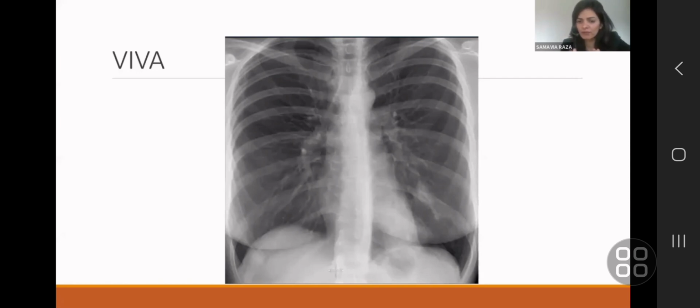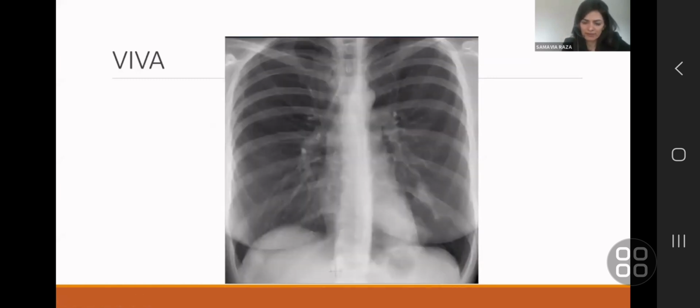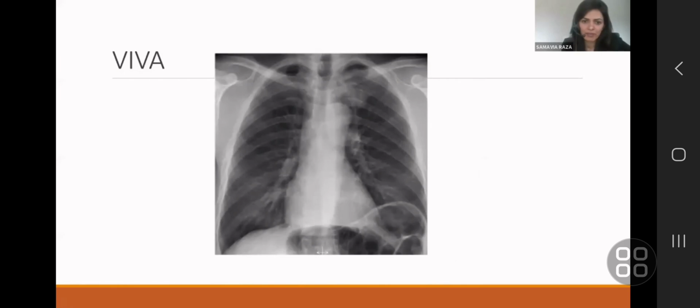There is no clear boundary or margin to it or lobulation to it. So yes, it's behind the heart. Yes, it's pathological. Yes, it's in the lower lobe. But is it a mass? You can't say that on here. And this one, I don't think is actually a mass. I don't have the CT for it, but this is left lower lobe consolidation. This one is the third one.